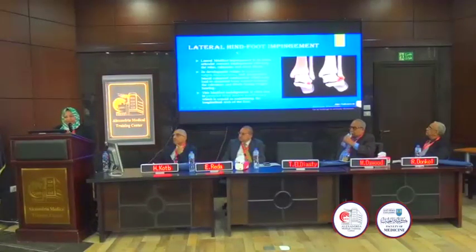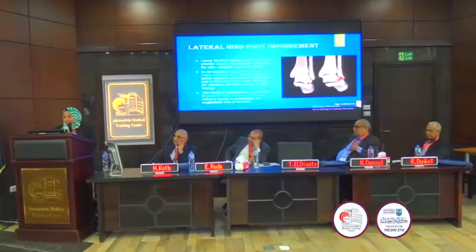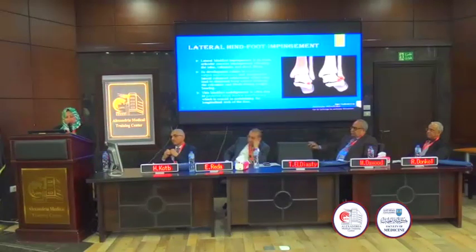Now we move to the lateral hindfoot impingement, and I included it in this lecture because here we are talking about the lateral hindfoot impingement and not true ankle impingement, as Prof. Marker said. This is an extra-articular osseous impingement affecting the talus, calcaneus, and fibula on the lateral aspect of the hindfoot, resulting from hindfoot valgus malalignment and progressive lateral calcaneal subluxation, which leads to unusual and abnormal conflict between the lateral process of the talus and the lateral aspect of the calcaneus, and progressively with the distal end of the fibula. It's usually associated with posterior tibial tendon insufficiency.